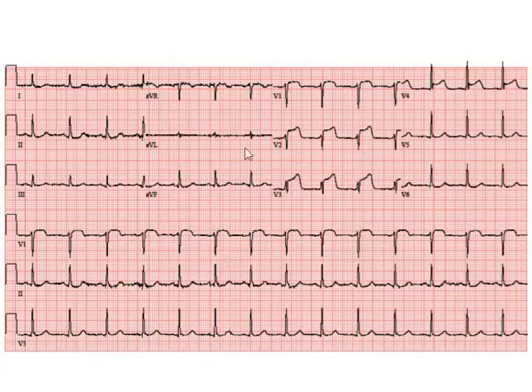At this time, there are no abnormal Q waves throughout the tracing, suggesting no evidence of completed infarction. If this patient had presented later, however, Q waves most likely would have been evident. The clear abnormality is the ST elevation in the anterior chest leads, V1 to V4, which is an injury pattern caused by an acute myocardial infarction.